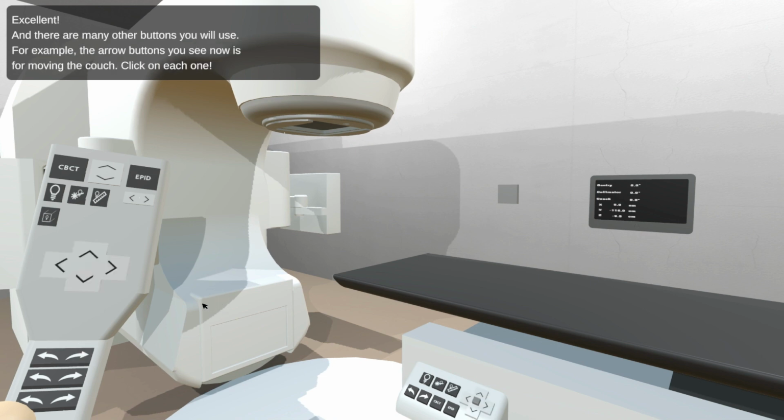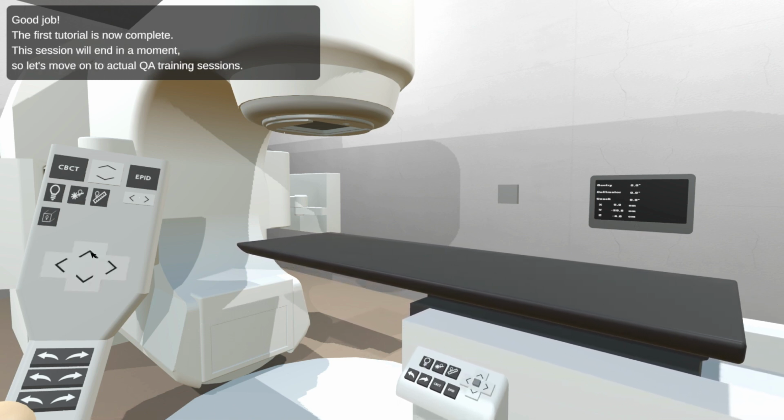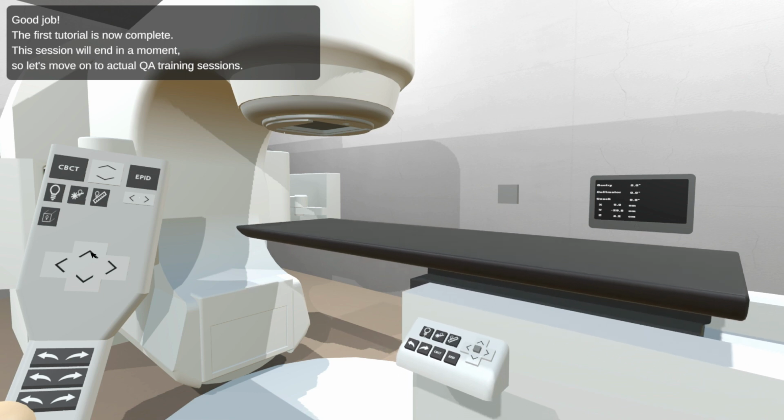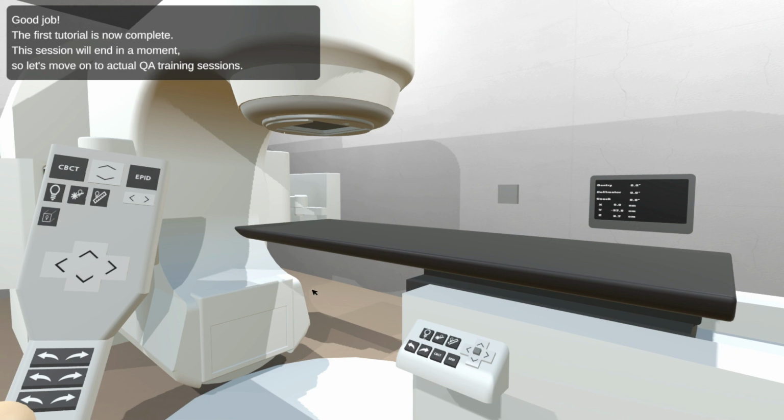Excellent. And there are many other buttons you will use. For example, the arrow buttons you see now are for moving the couch. Click on each one. Good job. The first tutorial is now complete. This session will end in a moment, so let's move on to actual QA training sessions.